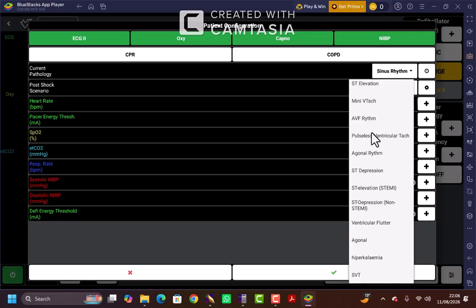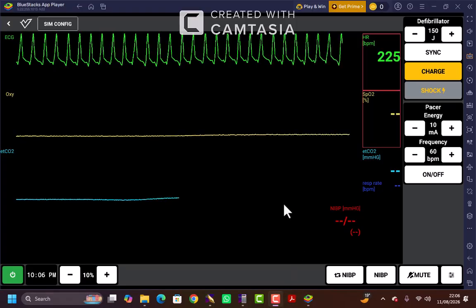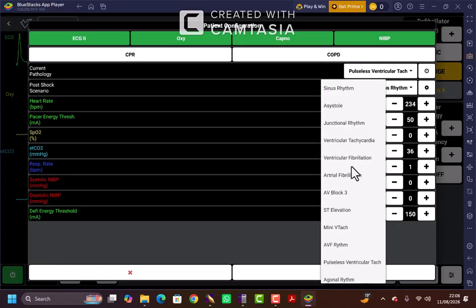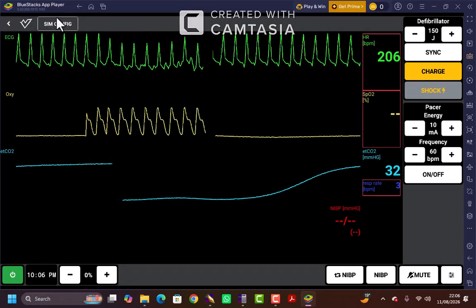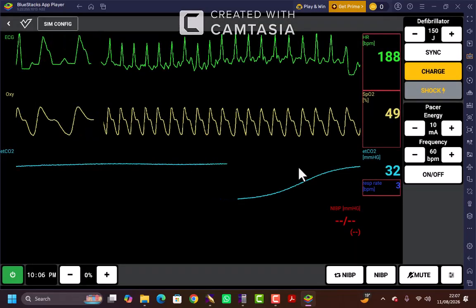First, I'll create, and we'll test my own scenarios. Okay, I'll change to 1 second.